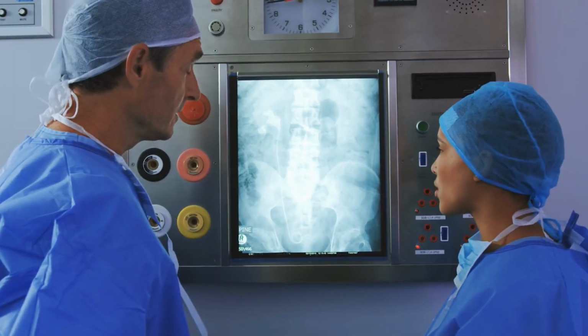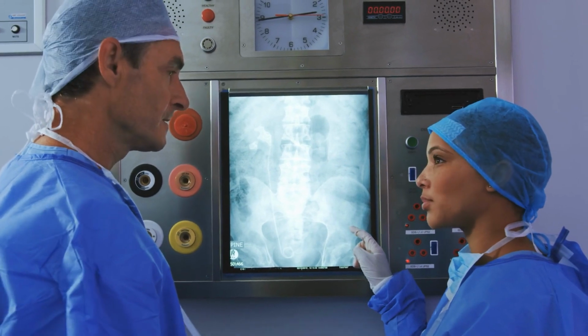Because about 50% of the time when I look at a radiology report, it's pretty obvious that the radiologist has incorrectly marked the Cobb angle. And that can have big ramifications on what treatment we provide and when we provide it. So it's always good to have the right numbers.